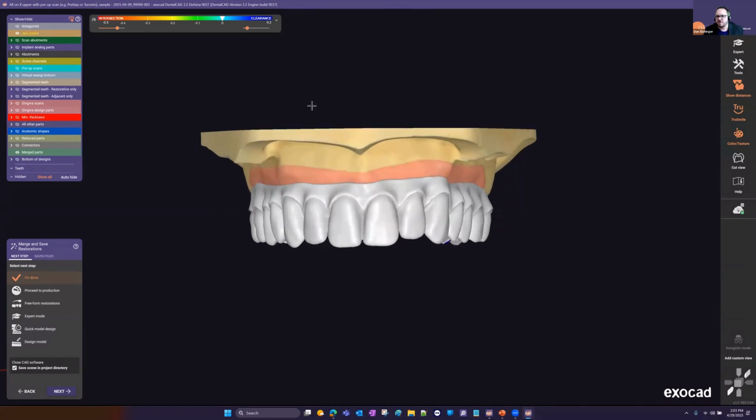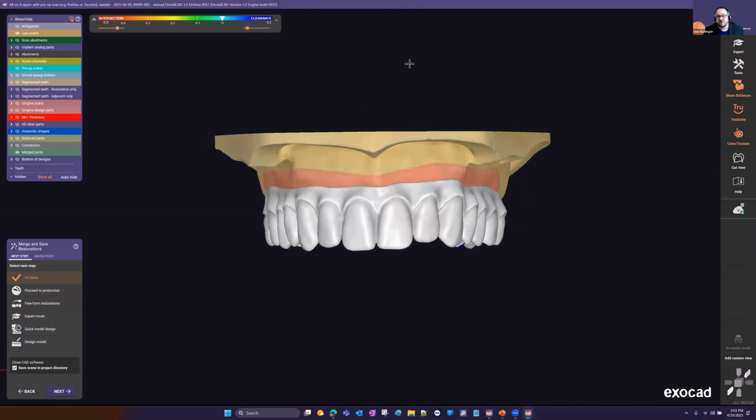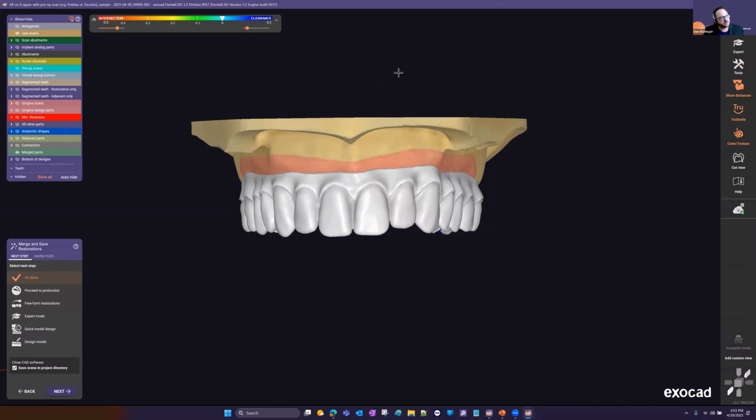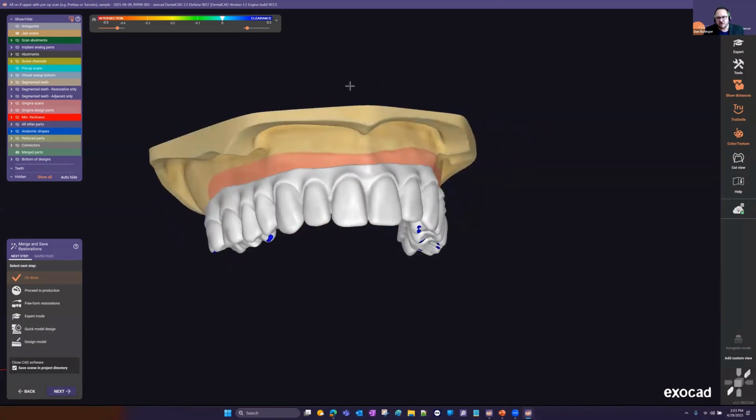With 3Shape specifically, they're not fully integrated. That's my understanding, and that's kind of their choice. We'll open up that workflow to any scanner manufacturer, where the scanner can be launched from our DB or automatic imports. Trio scans do have the integration, so that part does.